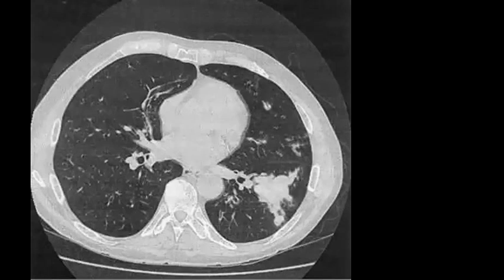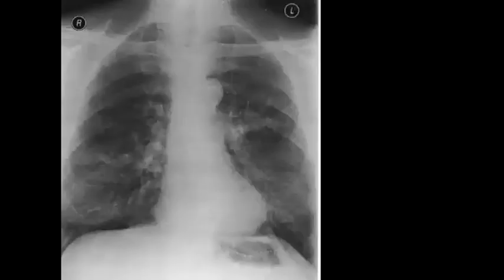So this is what is called allergic bronchopulmonary aspergillosis. So this is the first possibility. Okay, and it is like bronchocele appearance, so tubular opacities with cylindrical. So what do you think about this one?